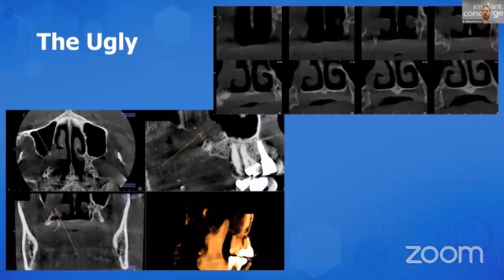Patient came in with an unusual numbing sensation on her right side, and it ended up being this. I should get the biopsy or find out what the end result was. It's a doctor that I'm familiar with, but this one, we know, again, being a detective, look at how the bone's just being destroyed, being eaten away.